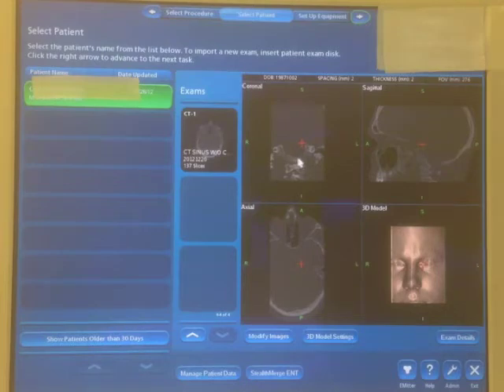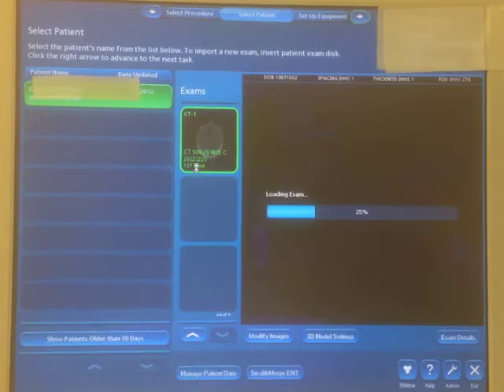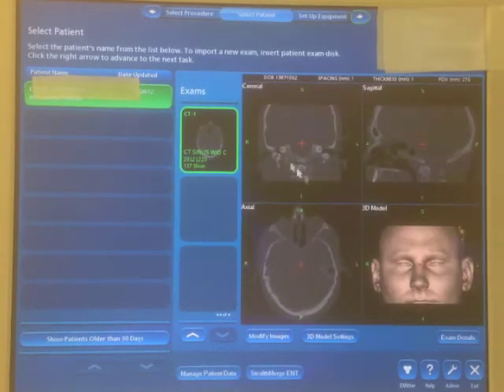If you choose one with not enough slices, the exam will be grainy as you can see here, and the 3D model will not be sharp. By choosing this CT scan, we can observe a better 3D model. Here you can see the end result, a well-detailed CT scan in all 3 planes. Additionally, a nicely formed 3D model.